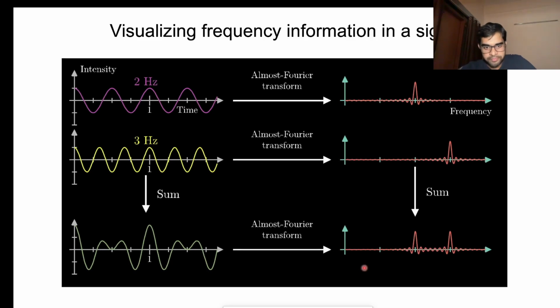So, is there any meaning of the relative position of these peaks? Like, in the frequency domain, quite possibly I may get these peaks quite close, and sometimes quite far apart. What could be the interpretation, or the significance of the distance between these two peaks?